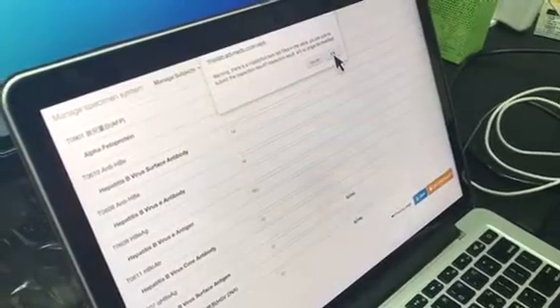And one more thing is that in the future you can combine with machine linkage, which means once you get into this page, the data will automatically be sent to here. Okay, so we finish this entry, then we just click submit. Alright, so it's done.